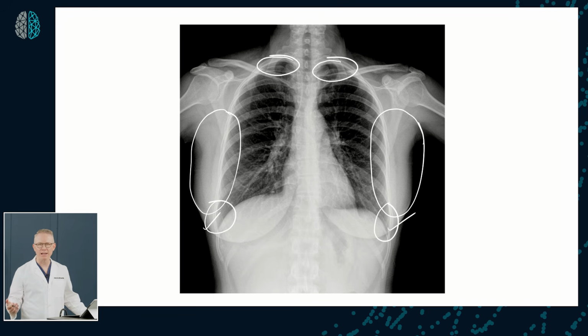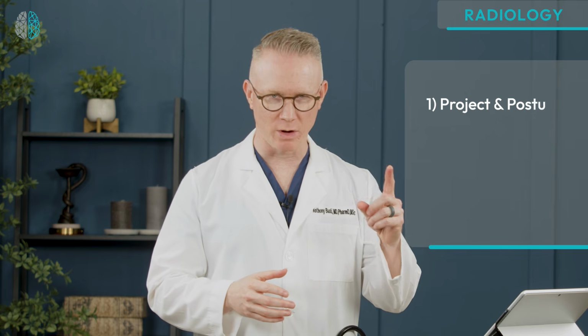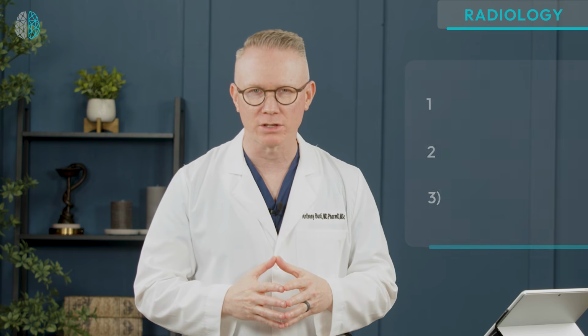Basically, if you can't see both the apices and both costophrenic angles, you can't fully clear the lungs. And that image is not sufficient. It may be the best image you can get at the moment, but you probably need to repeat it. All right, so those represent the three considerations in determining the right positioning of a patient getting a chest x-ray. Number one, projection and posture. Number two, rotation. And number three, centering and also coverage.